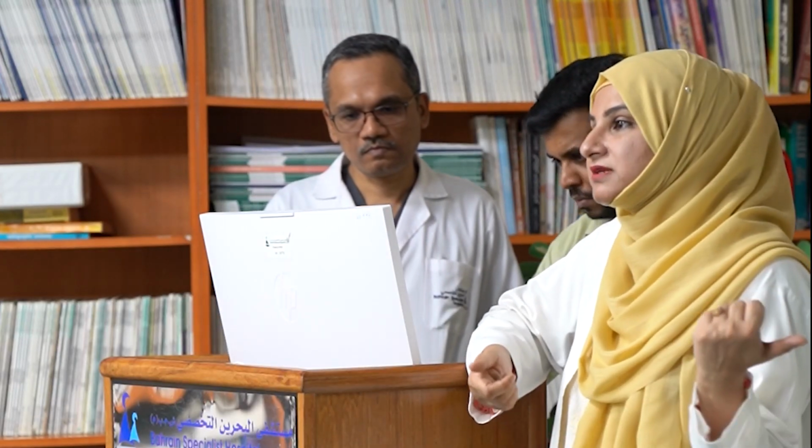In this case, the biopsy was done because radiology was more in favor of an HCC and the alpha fetoprotein was normal. Usually the tumor doubling time is around 4 to 5 months. So between the previous scan and the MRI done yesterday, is there any change in the size? I will check, because in the MRI only one sequence was taken. I can check the size. Because it grows very rapidly, yes.